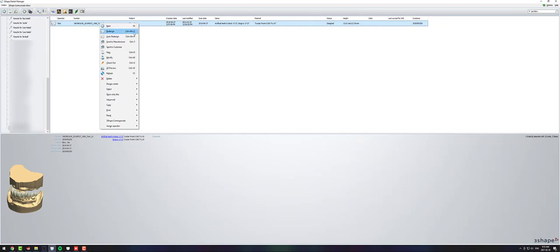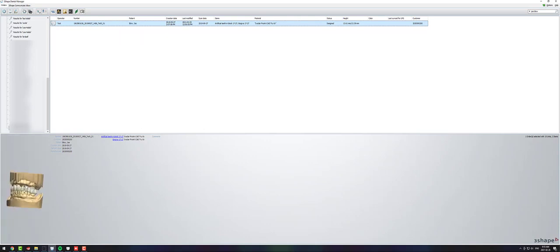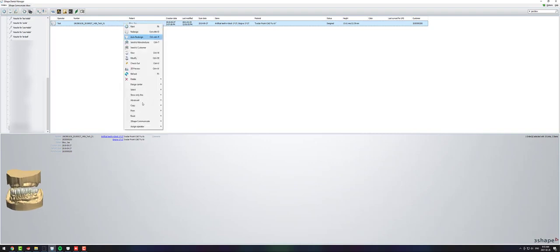3Shape is nice because it actually shows you all of the keyboard shortcuts. So I would just go through and maybe write a couple down on a sticky note and put them on your computer, just the ones that you want to use the most. For the 3D preview, it says Control W, but you can actually just double click on this little image down here and a 3D preview will pop up. There's a lot of great shortcuts in here.